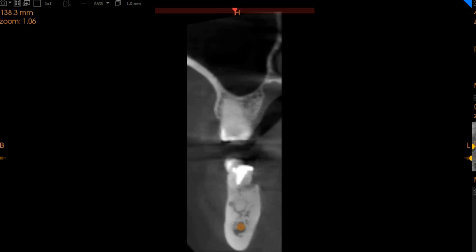And when we look at the tooth on the lower left second molar, we've got a D1 very radiopaque bone with very little cancellous bone. And here we can see we've got 7 millimeters of ridge width with approximately 9 millimeters of ridge height.